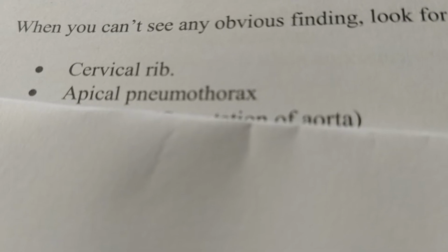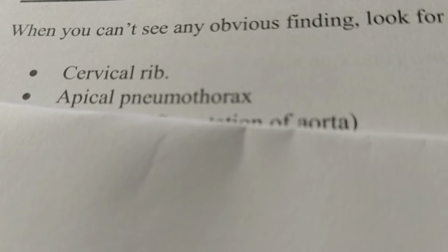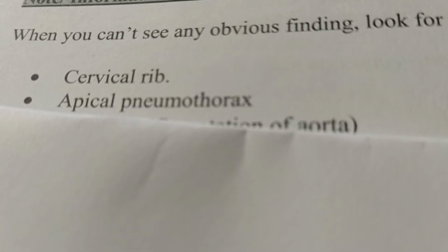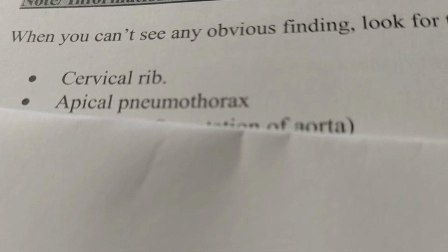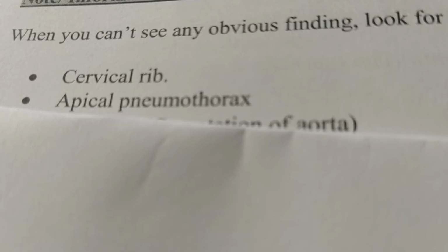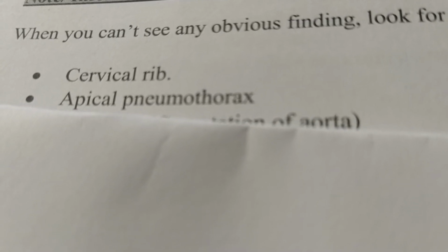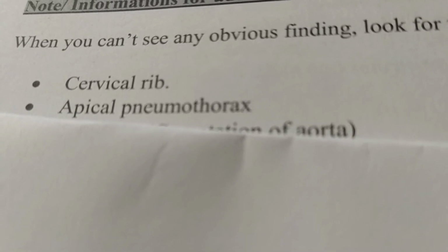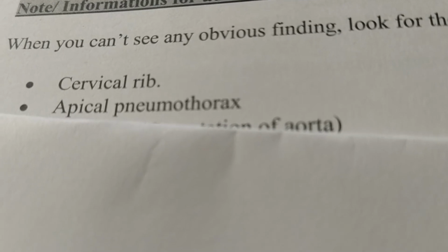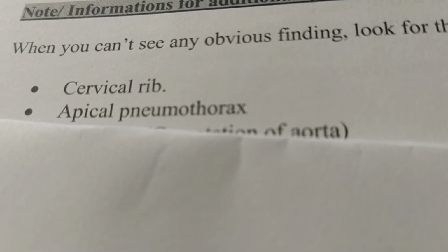Reading a chest X-ray is sometimes very difficult, as sometimes a chest X-ray appears very difficult to interpret. So there are some points to keep in mind when you find nothing on looking at the X-ray. When you cannot see any obvious finding, look for the easily missed findings in the X-ray.